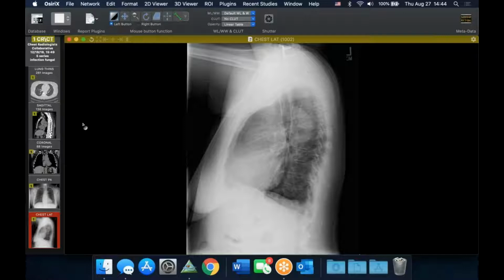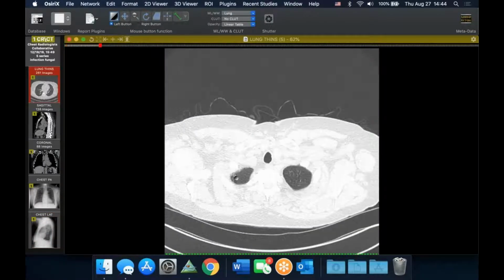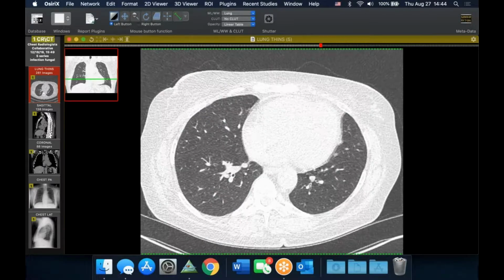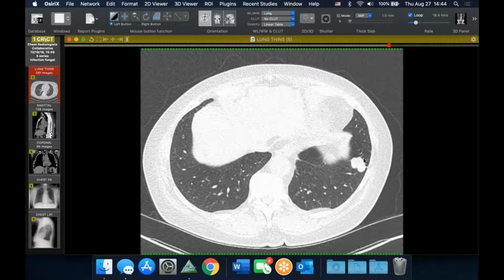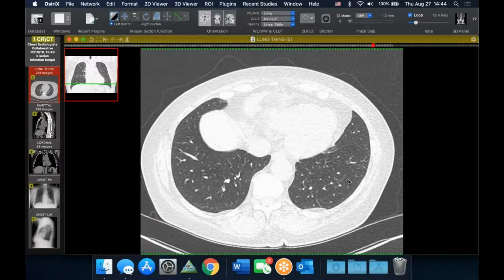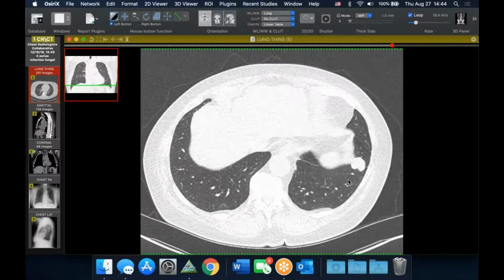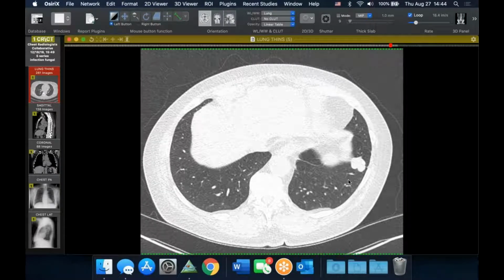I think of cryptococcus as one of the big ones for large nodules. And of course, malignancy is always a concern. So she had a CT scan, and the CT scan shows this sort of bilobed, well-circumscribed, fairly large nodule in the lateral basal left lower lobe. So CT doesn't really change the differential at this point, but you need tissue.